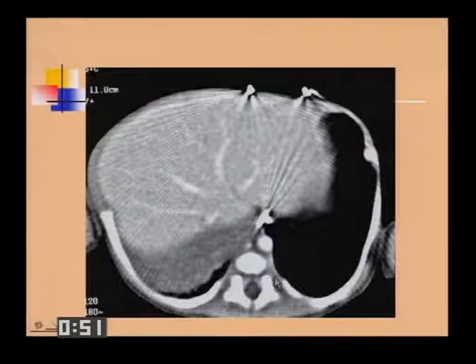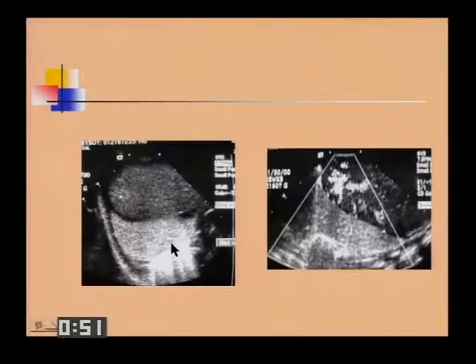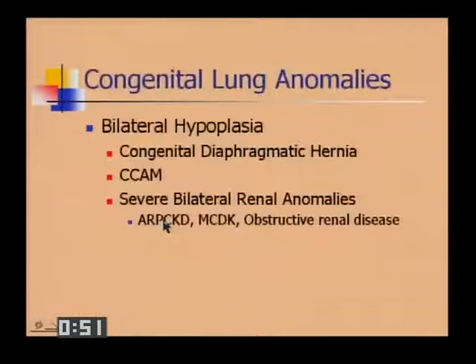This is one that didn't have an abnormal blood supply, with a lot of artifact from leads. We kept looking for it. Similarly, you could look with Doppler, trying to find the colored vessel, how much blood supply is within it, how much blood supply is not within it. This was taken out as what's called a sequestration, although we never did find a nice feeding vessel. But only 80% have a vessel off of the aorta.